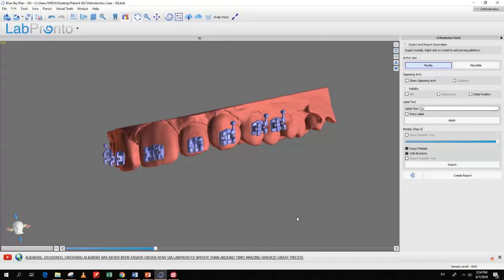IPR reduction. So we've demonstrated that by moving the teeth, you could reduce the IPR. We're also improving, in a future release in the not too distant future, the algorithms so that when you snap to curve, the IPR is going to be reduced as much as possible.